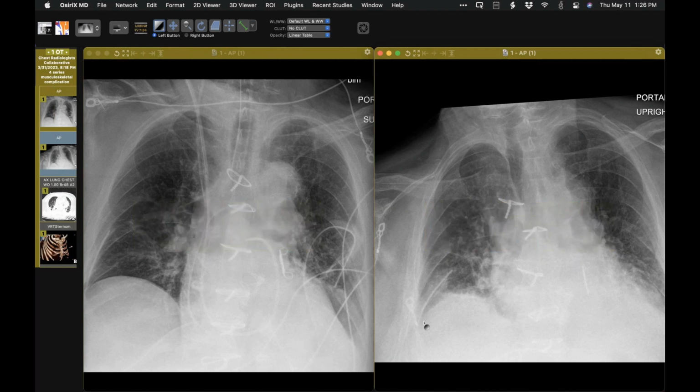Tubes are out, of course, and so on. Superior wires going the other way. Yeah, isn't that interesting? I mean, we don't usually see that so soon after surgery, but that's exactly right. These seem to be aligned kind of okay, but this one's clearly off, and that's exactly it.